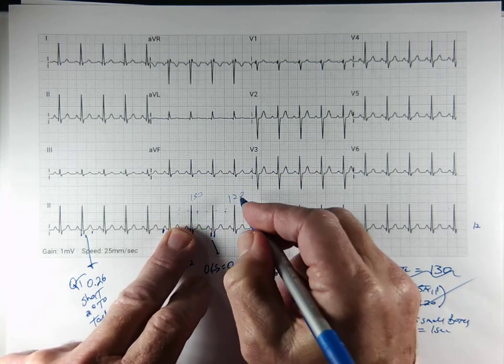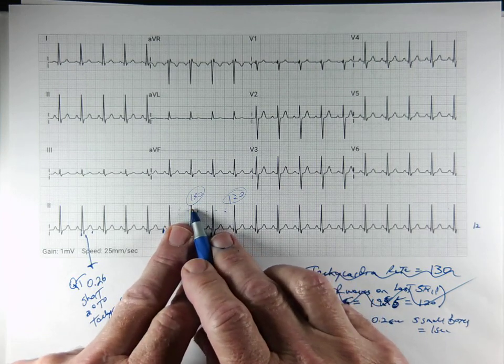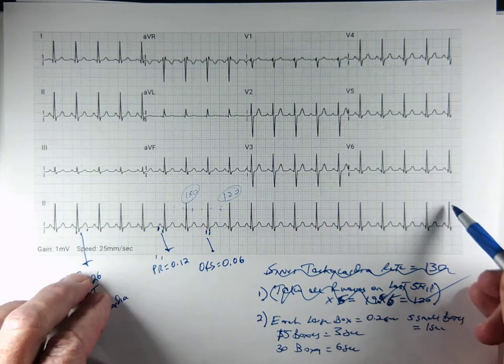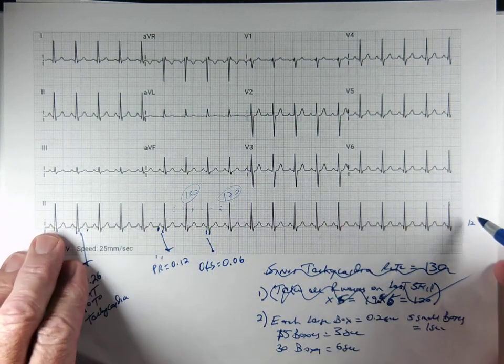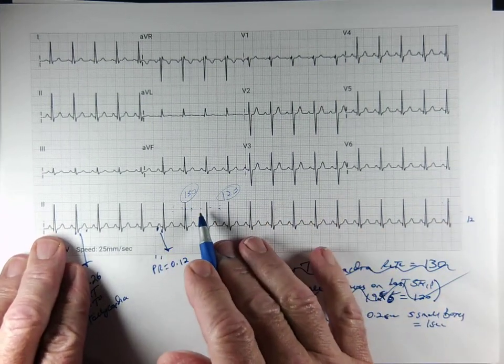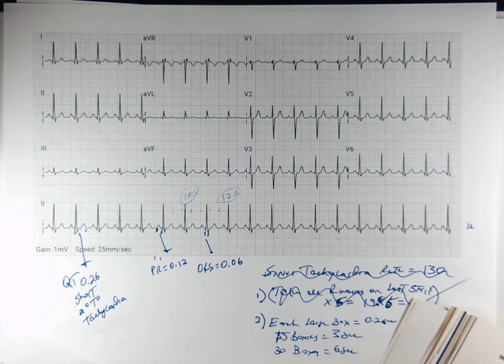So once again, the faster the rate, the less accurate it's going to be, because you can't really figure out exactly where it is, and depending on where you started, there might be a little gap where the next beat would have come, but I'm pretty close. I know that's still a little bit confusing. There's a very good explanation of it in the book, which is here.